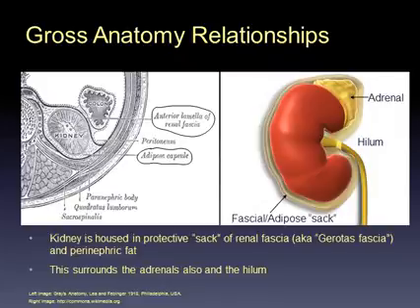The importance of this fascial sac in scanning is that because it is dense connective tissue, it is hyperechoic and shows as a bright white line. This is an important sonographic landmark, as we know that fluid that is outside this white line is free fluid in the abdomen, and fluid that comes within that line is coming from one of the structures contained within the sac.